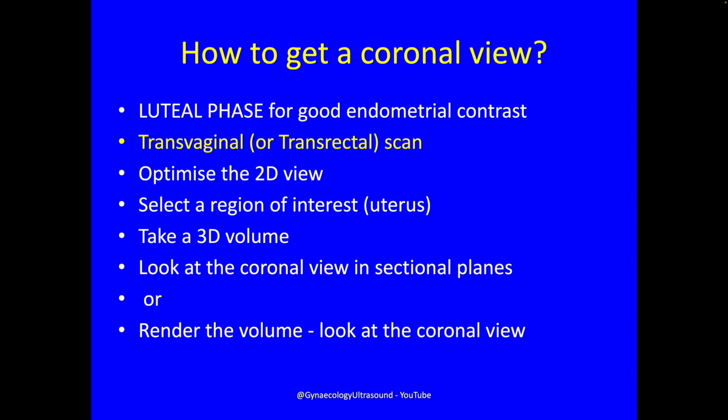How to get such a good view? Most importantly, do this in the luteal phase if you can, because then you get a really good endomyometrial contrast. You can do it on transvaginal scan or transrectal, but very importantly, you need to optimize your 2D view. The 3D is only going to be as good as the 2D view, so make sure that you've done everything you can to make that as nice as possible.